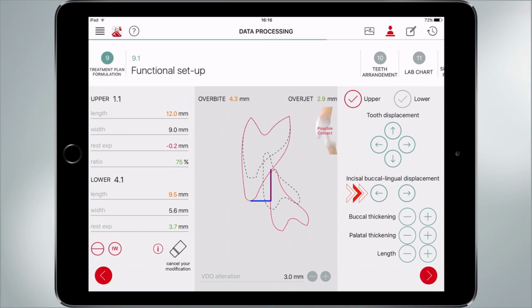At this point, you can also reduce the length maybe of the lower incisor, still keeping the contact, become now 4.3 and 9.3 in terms of length. You can do even more, it's 9.2. And you can put more lingual, the upper again. You still have a contact. So you can move it. You can have a customized value, or if you like it, you can keep the value that GETApp gives to you.